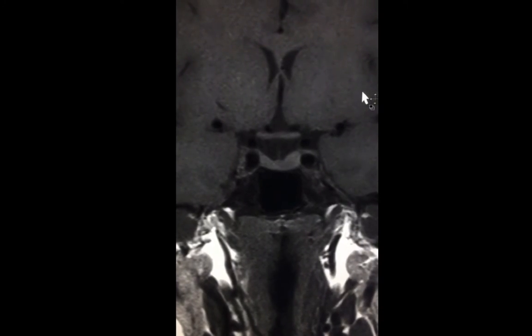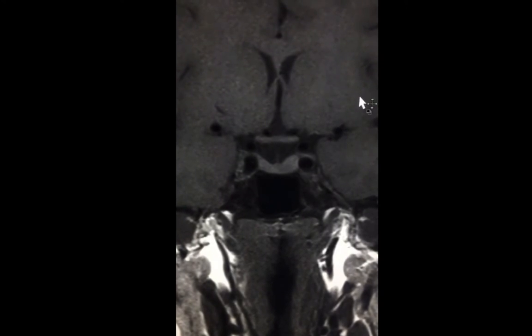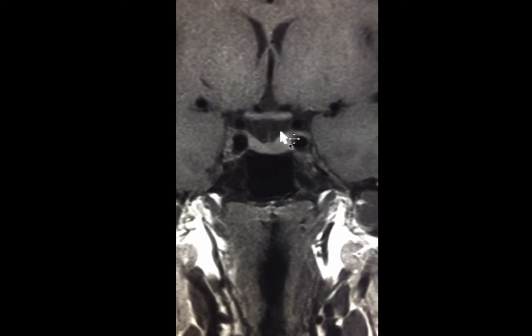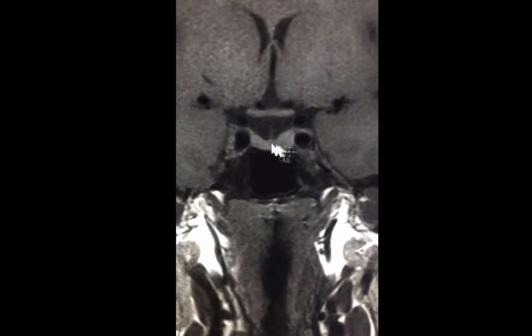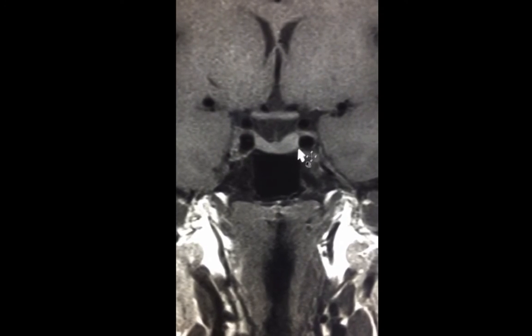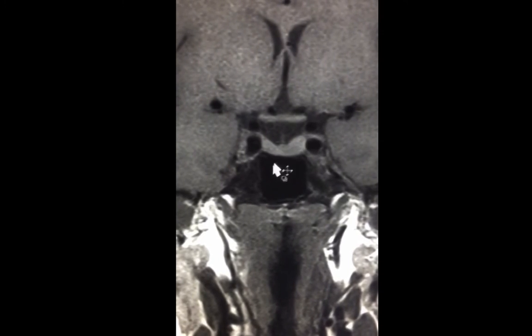From the provided clinical information, the clinician already knows that the patient would likely have a functioning pituitary adenoma. What the clinician really wants from the radiologist is to assess the relationship of this abnormality to the important surrounding structures. I'd like to know from you if there is extension into the suprasellar cistern and compression of the optic pathway. He would also require information about the status of the adjacent cavernous sinus and the internal carotid. Additionally, he would like to know as well the status of the sella turcica, if it's expanded or remodeled, as well as invasion into the paranasal sinus.